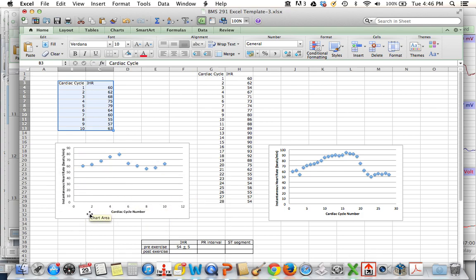So in here, I want you to tell me which of the cardiac cycles corresponds to the onset of breathing in, inhalation and exhalation. So definitely tell me that, and then also indicate on here what the average heart rate is. So it's going to be, in this case, probably somewhere around here for 70 in this example, or maybe a little lower, maybe like 65 or so.